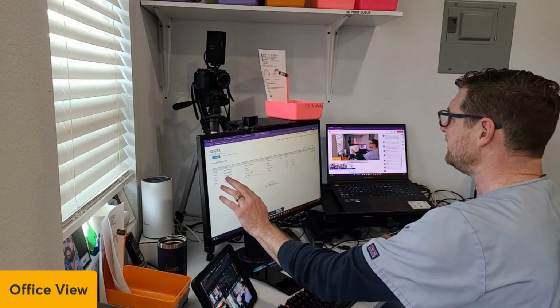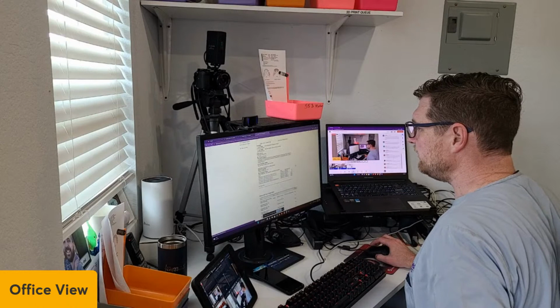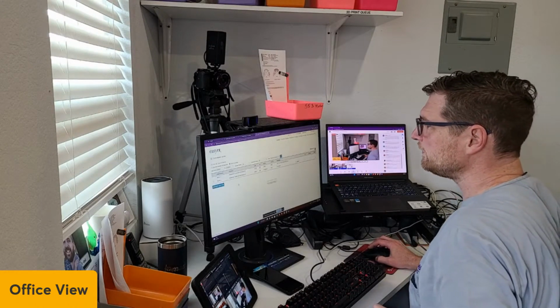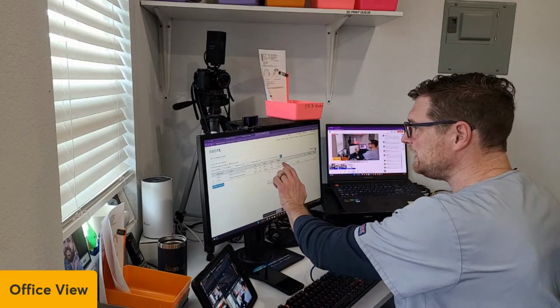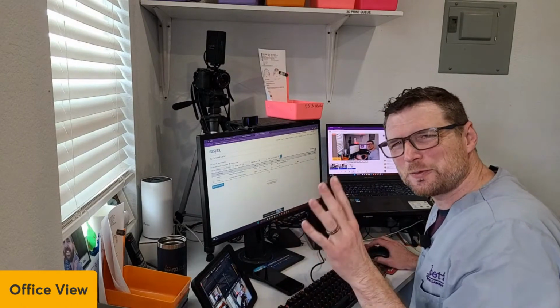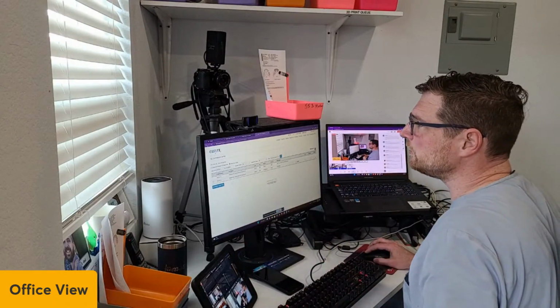So I'm actually going to view this real quick, and I'm going to go to 3D Command Center, and you can't see it very well, but right here it says failed. It says too many non-manifold geometries or whatever. So it's the auto base, pretty good, but sometimes it fails on you. So I am going to go back.